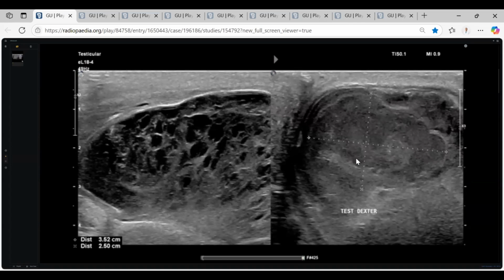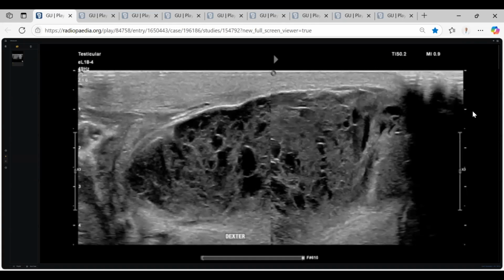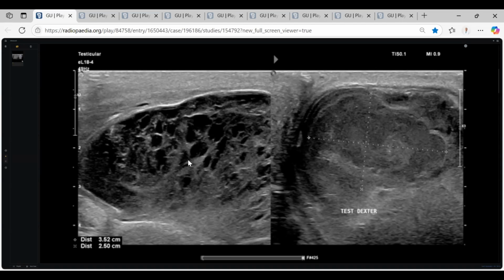So what's your diagnosis till now, with the history of trauma? So, testicular fracture. Not fracture, sorry. Fracture means that the tunica is intact. This is something more severe than fracture, where the testicle releases some material here. So it is a rupture.